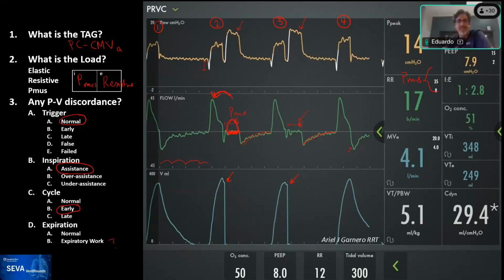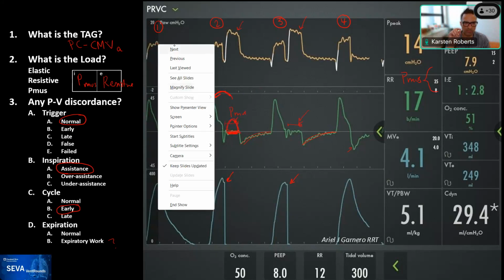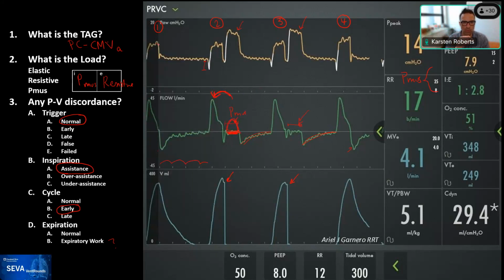So this particular ventilator doesn't allow you to take a breath in. So we have the zero flow state during that first part of expiration. So I think that makes complete sense. And I think it's important to point out, if we were doing a breath hold ourselves, what would the expected outcome be? What would we see potentially on one of these other, either breath 1 or breath 4, if I did an inspiratory hold on a pressure controlled mode of ventilation? What would the outcome be?